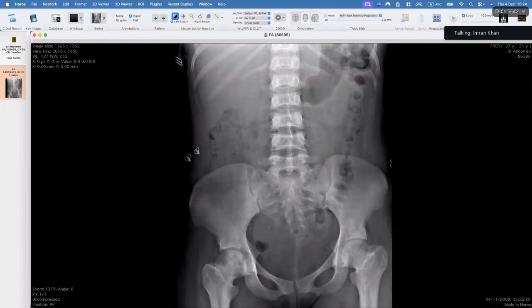What would be the relevant negatives, bearing in mind this patient has got an abdominal X-ray? So we've done it obviously for abdominal. I could not appreciate splenomegaly, so I would check if there is any history of splenectomy, or it can be autosplenectomy as well. Or there is definitely no definitive AVN on the left side. Can I finish? Sorry, yes. No, it's fine.